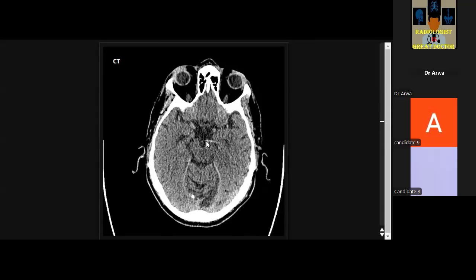It's asymmetrically dense, but it's relatively straight for the course of the posterior cerebral artery. I had looked at it. I thought it's quite straight for the posterior cerebral vessel. But there is a hyperdense vessel in the posterior half of the circle of Willis, asymmetrically dense as compared to the right side, likely representing left posterior cerebral artery thrombosis.